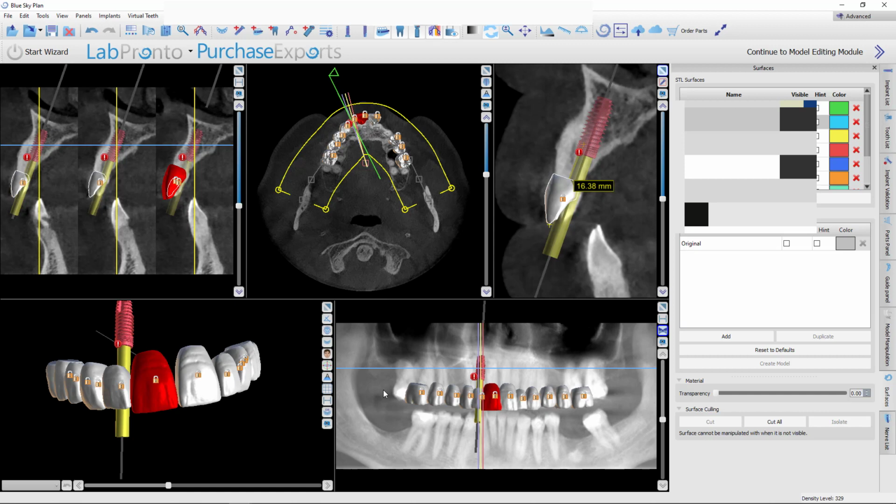ugly. There's far too many cases being done generally that are not done this way, and you're ending up with subpar results because you don't have adequate interocclusal space, or you have too much. There's just too many unknowns. So there's zero unknowns at this point. Now we know exactly where teeth belong, and we can plan accordingly for whatever type of restoration that we want.